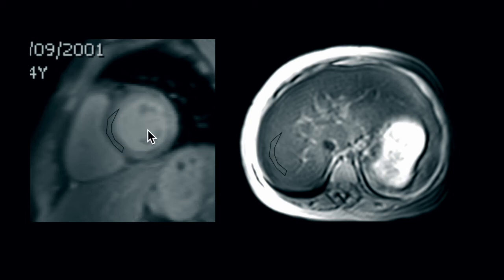It should not include the cavity, and it should be away from the blood and the myocardial interfaces. For the liver, the ROI should be within the liver parenchyma. It should be away from the margin. It should be away from the vessels and the biliary tree.